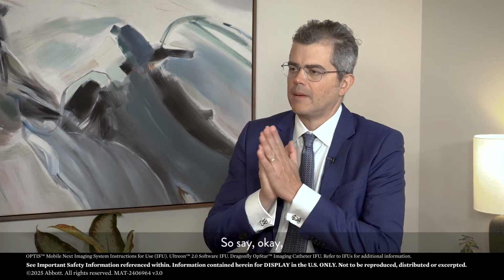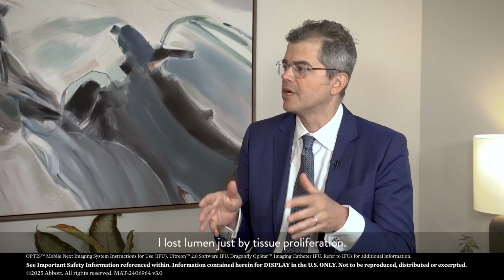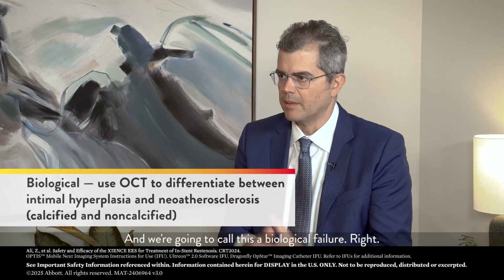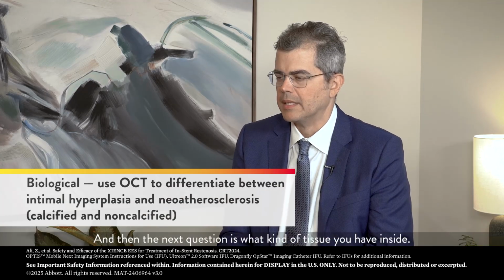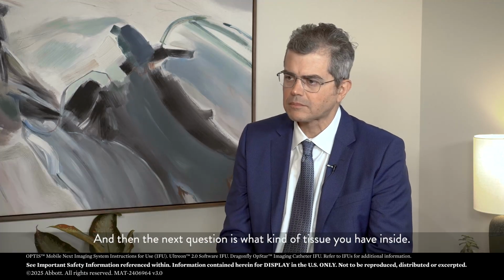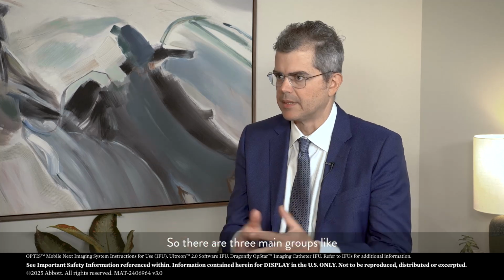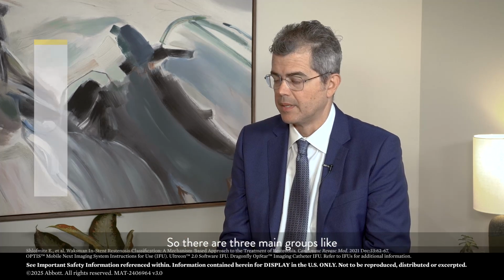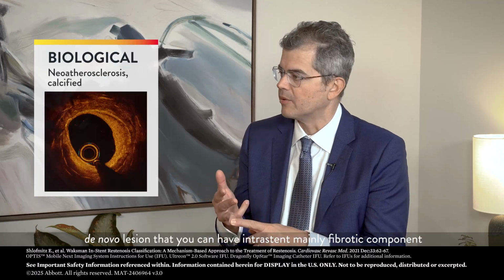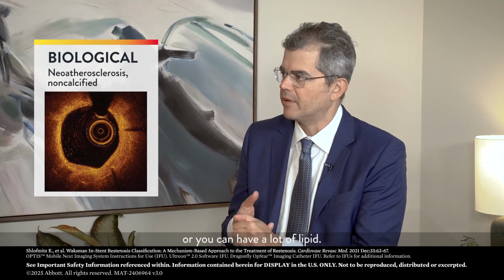So you say, okay, prior stent is properly expanded, I lost lumen just by tissue proliferation, and we're going to call this a biological failure, right? And then the next question is what kind of tissue you have inside. So there is three main groups, like a de novo lesion. You can have intrastent, mainly fibrotic component, or you can have a lot of calcification, or you can have a lot of lipid.